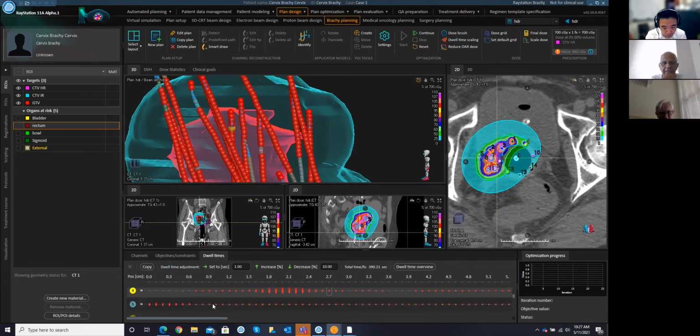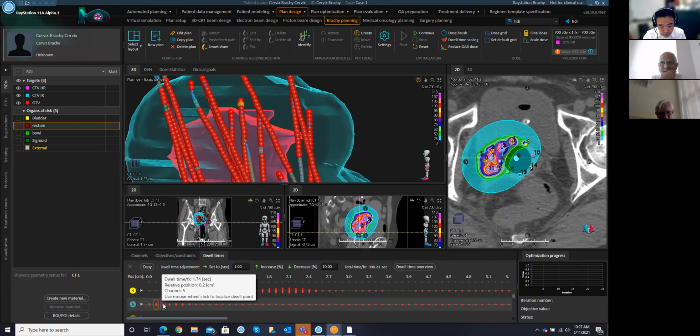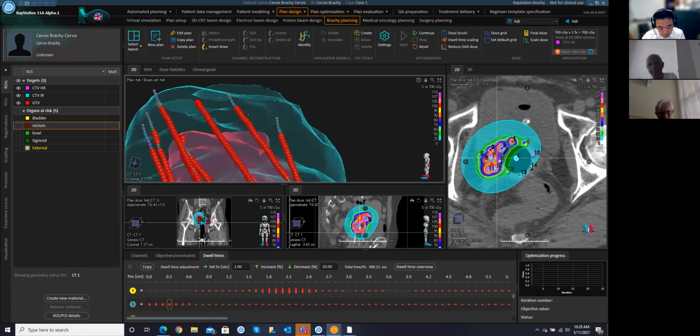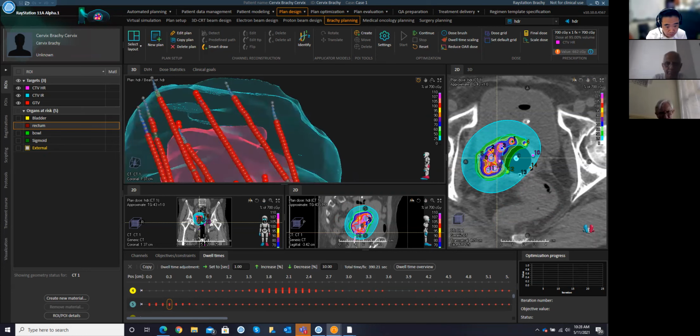Correct. Yeah, you can start from the other side, and then there's this tool, flip, that flips it, and it's indicated. The tips are pointy in the visualization, and the ends are funnel shaped. Maybe you can show it, David.